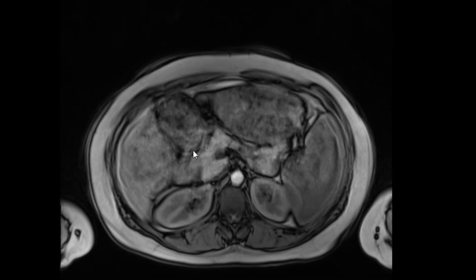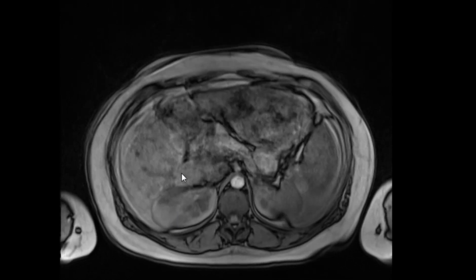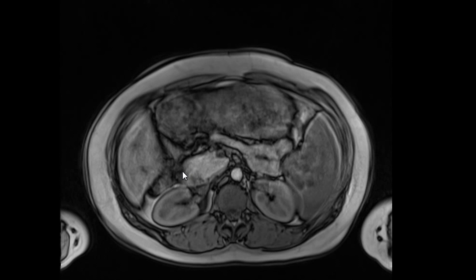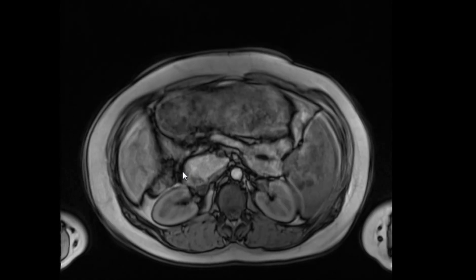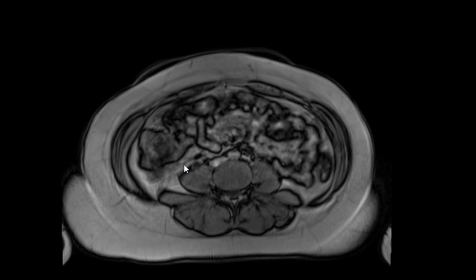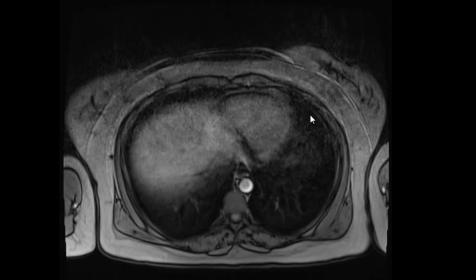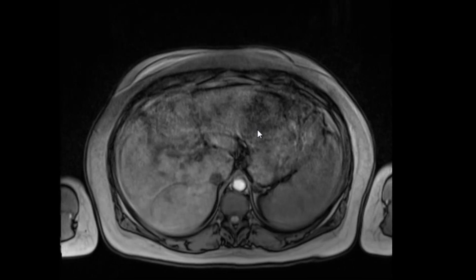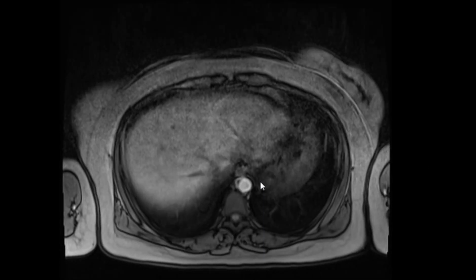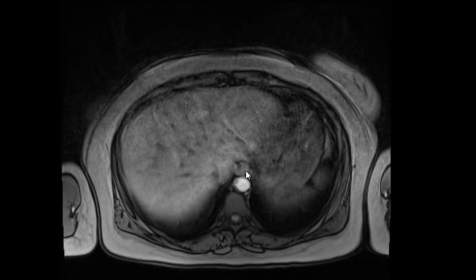Other than duodenum, what else should be distended in cases of gastric outlet obstruction? Antrum, pylorus. Okay. Esophagus will not be distended? Yes. Okay. Is it distended here? Esophagus? It's completely collapsed. You can barely even see it. This one, you see the esophagus? Yeah, exactly, this one.